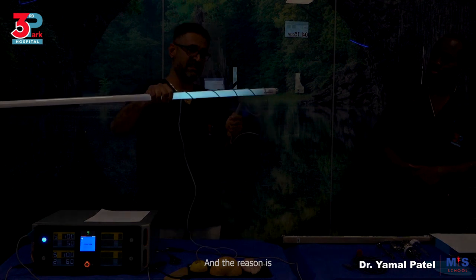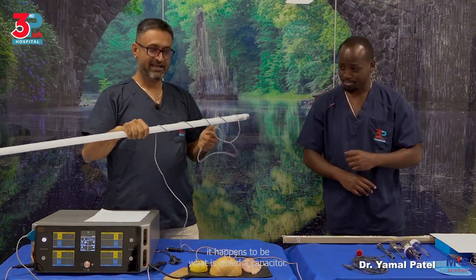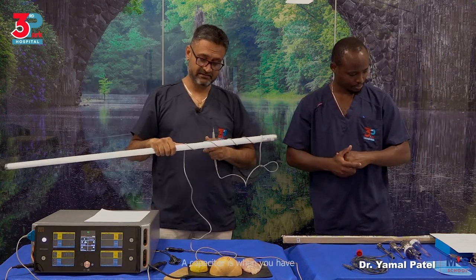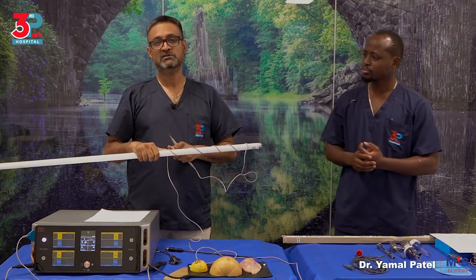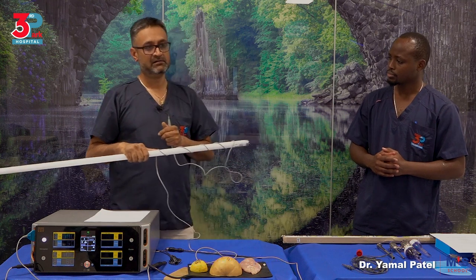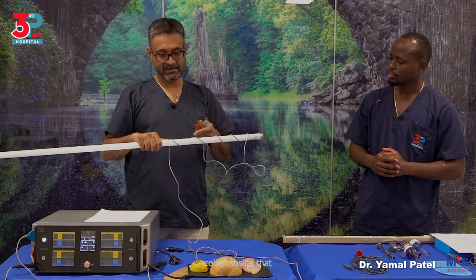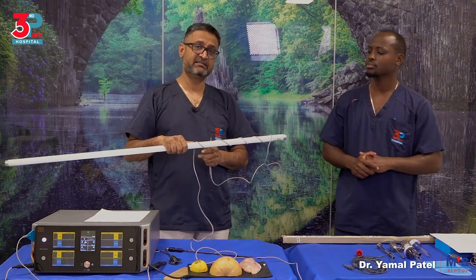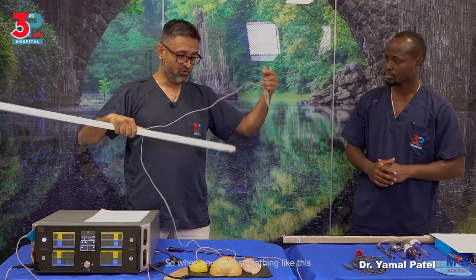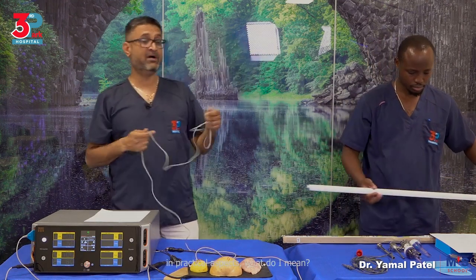And the reason is this winding of the cable around it happens to be what is called a capacitor. A capacitor is when you have 2 electrodes separated by an insulator. So you will get the electricity collect inside that structure. So when you have something like this, in practical aspects, what do I mean?